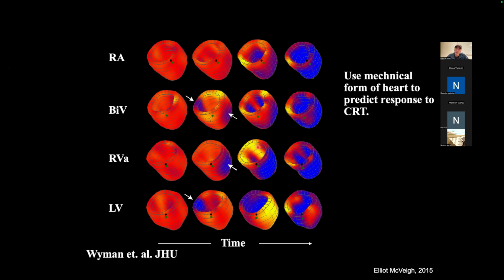And that's what the yellow color means. The circumferential strain has gone positive. At some later time, it gets activated and it does participate in the contraction like the septal side did. However, it's late. And so it's called a desynchronous contraction.